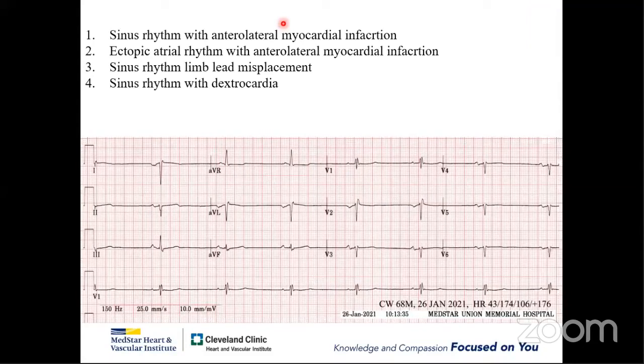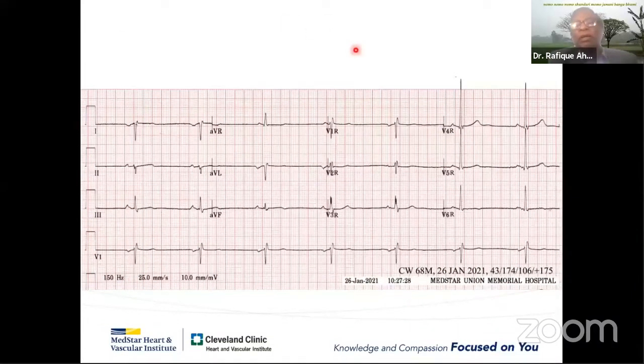No, sir. Not this ECG. The second one, sir. So from an adult cardiology standpoint, we cannot think that complex. For this ECG, all of us adult cardiologists will just think of limb lead swap if you did not tell me that the chest leads are right-sided. And we are going to repeat the EKG to confirm that.